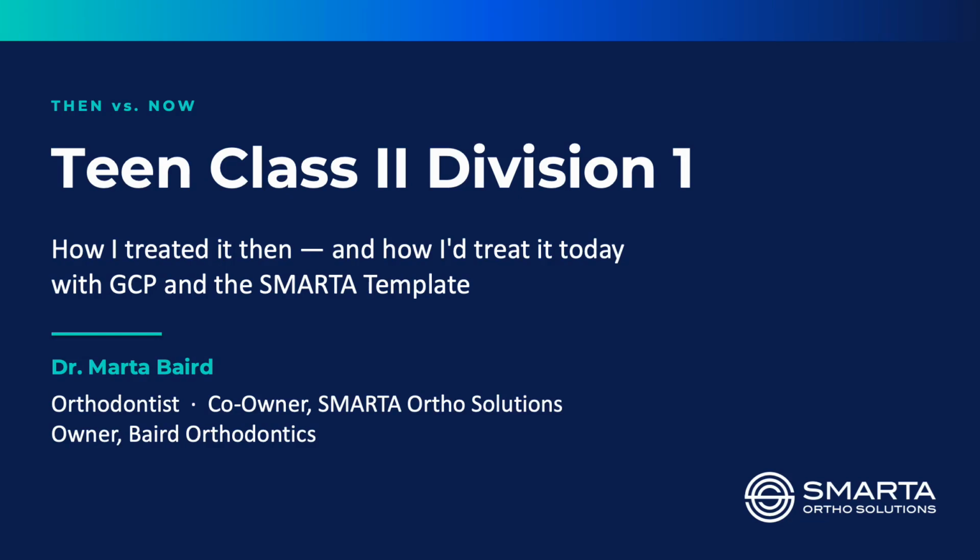In this video, I'm going to walk through a patient that I treated in 2024 that's finished now, and she is a Class 2 Division 1 patient. I'm going to show you how I treated it then, end to end, all the way to the final series of aligners. And then I'll show you how that would compare if we uploaded the case today using either the Global Clinical Preferences Align Default template or if we use the SMARTA template.